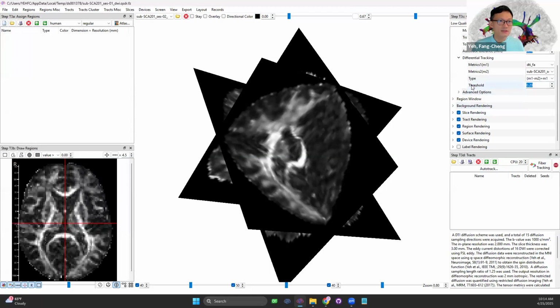Once ready, there's another thing called a threshold. So this threshold value will be applied to the calculation here. As you can see, this calculation computes the percentage decrease. 0.2 means a 20% decrease. That's quite a moderate, decent, large value, I would say.